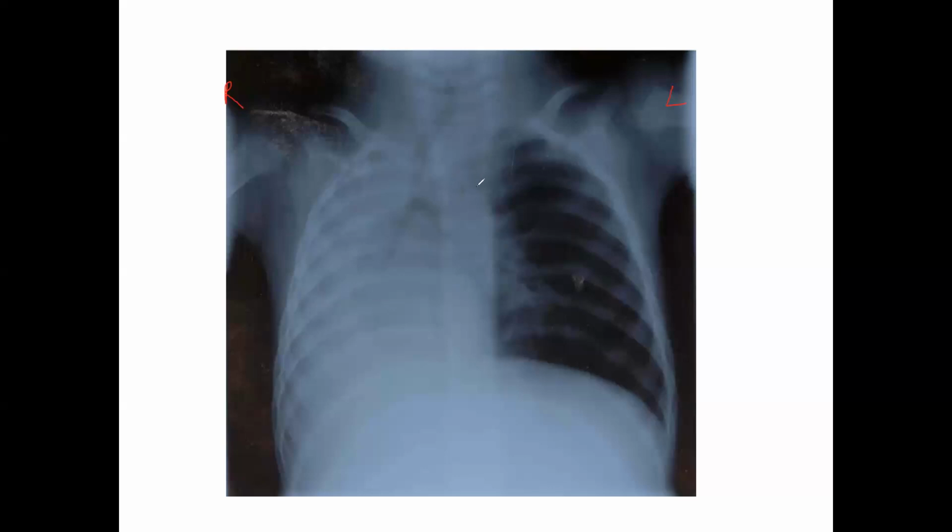When you're assessing your trachea, the trachea should be midline, and you typically do that by taking your two fingers and running that down the trachea through the suprasternal notch to make sure that everything's midline as best you can tell. So looking at this particular x-ray, your trachea, you can see, and I'm going to trace it for you. Your trachea has a bit of a sigmoid shape to it, and you can see the right bifurcation and the left bifurcation, with the actual carina being right here. So the bifurcation of the trachea is the carina.